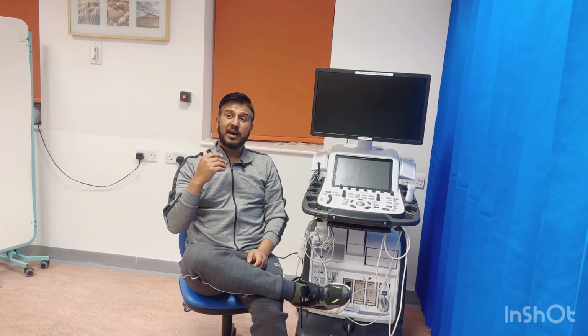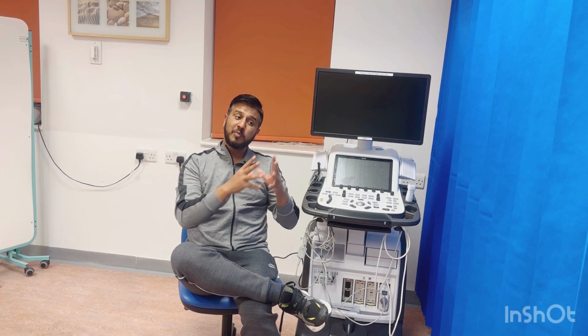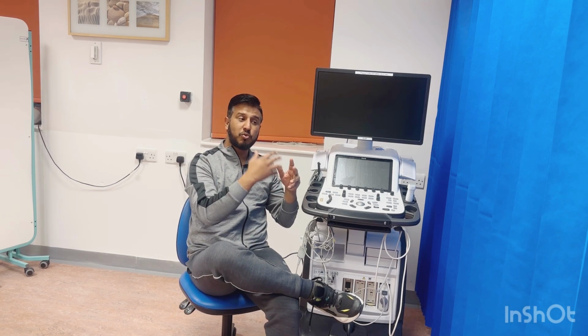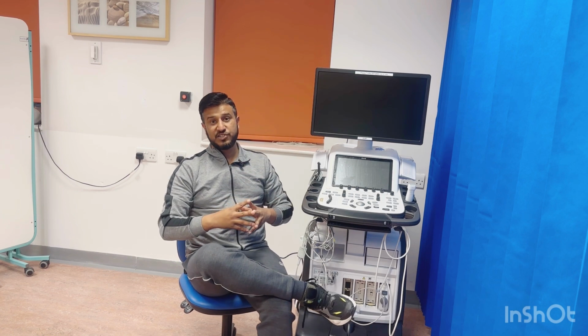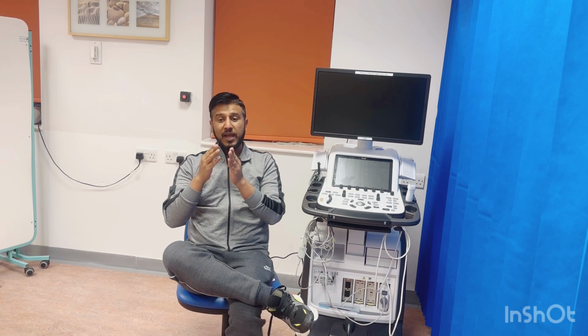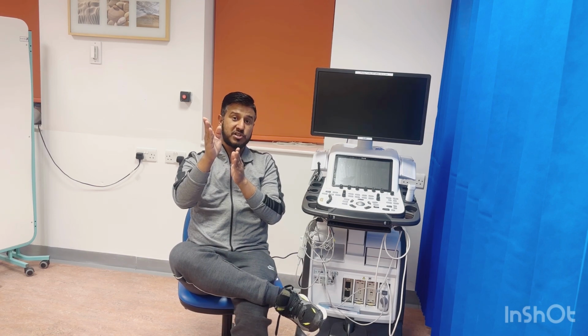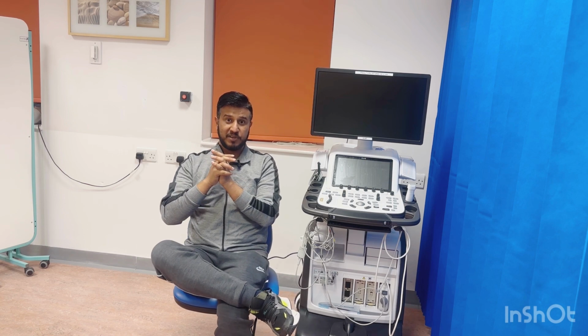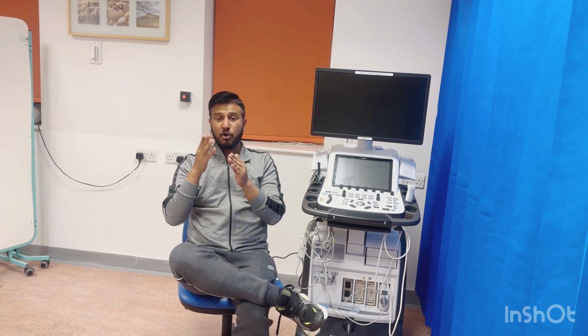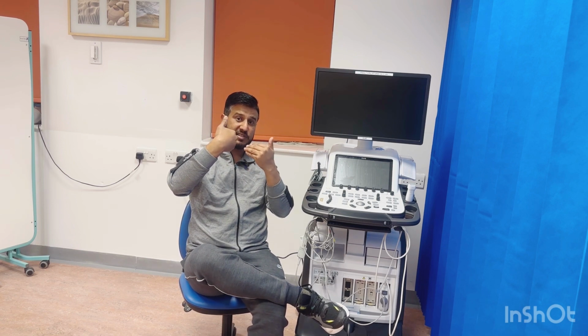As I told you in the last vlog, once you talk about the etiology, you will also be giving a hint towards your regurgitation jet. For example, if you are saying a leaflet is prolapsing, the regurgitant jet will be going opposite to that prolapsing leaflet. For example, in the long axis view, when you are having two leaflets, this is the right and this is the non-coronary.